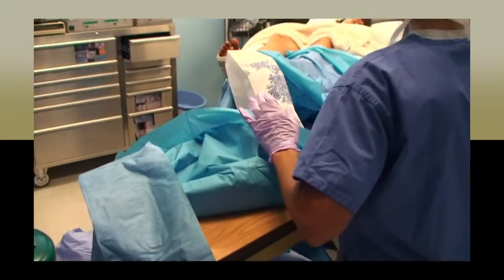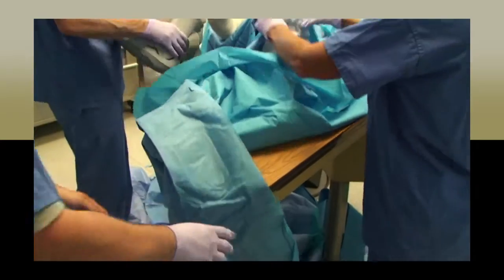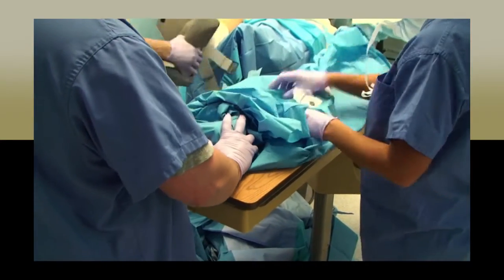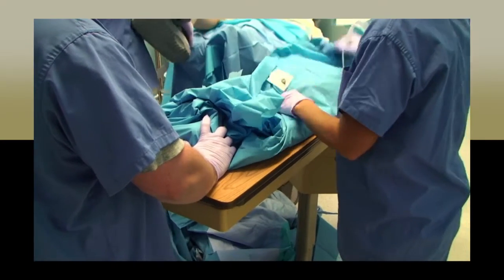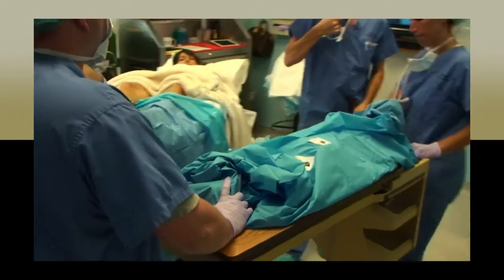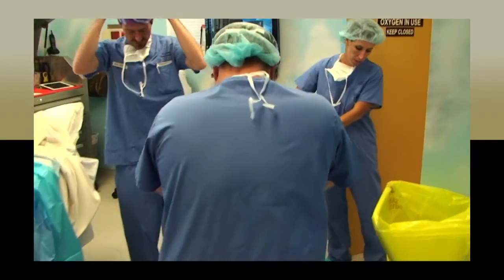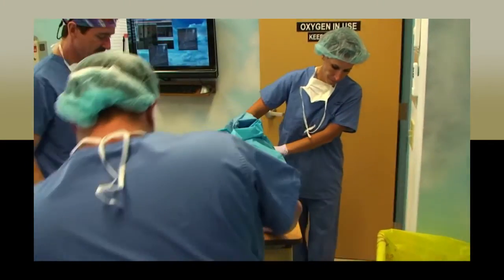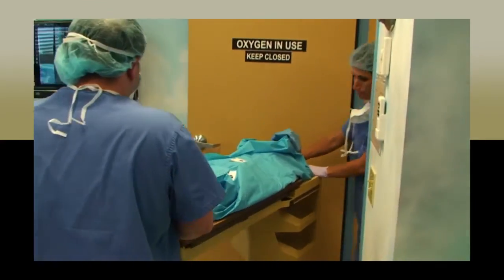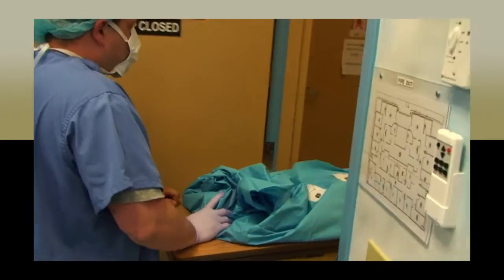When a case is completed and the appropriate paperwork has been completed, you will then focus your attention back to the surgical instruments and preparing them for the next case. Be sure to exercise all universal precautions when handling soiled instruments, which includes masks, gloves, and gown. Instruments will remain on the surgical field and the edges of the field will be folded over them to cover them, at which time you will wheel the stand out of the front entrance of the OR and into the dirty nurse's station to be sterilized.